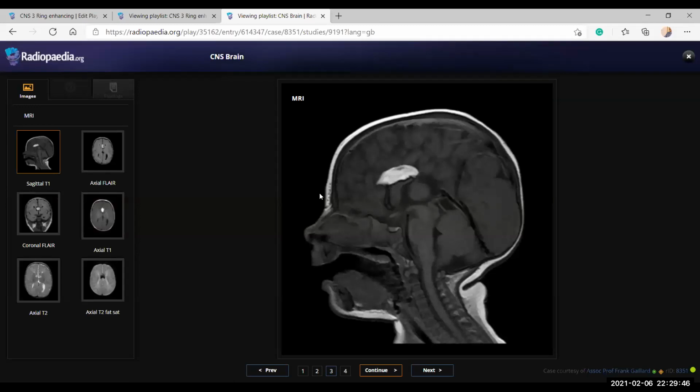Okay. So this is a multiplanar MRI in sagittal reformatted T1, confirming a fat signal intensity mass lesion in the pericallosal region with the poorly developed posterior part of the corpus callosum. I think there are two types, I don't remember. So this is corpus callosum dysgenesis with pericallosal lipoma. I will confirm also in the coronal scan.